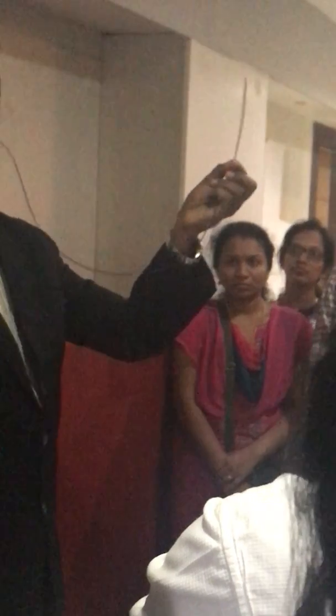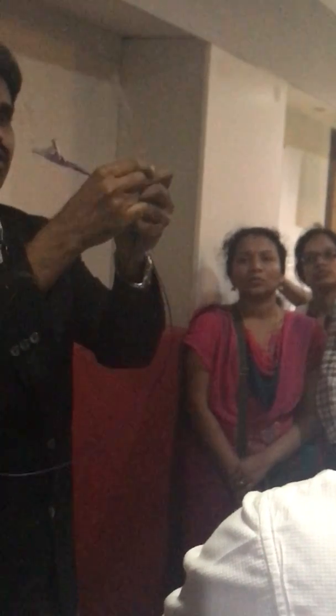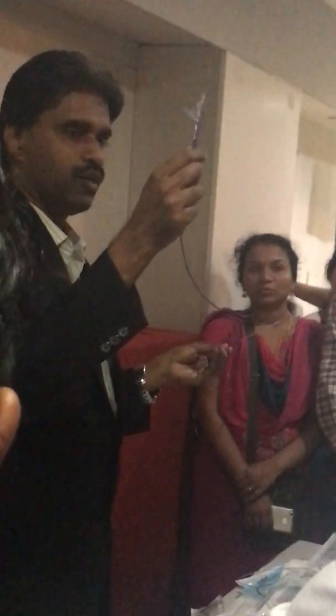What is this catheter? Balloon. This is a balloon catheter. Okay, you'll see there are two lumens, and also you can see the balloon. So why are there two lumens here? One is for flushing, the other is for balloon inflating. So how will you know which one is for flushing and which one is for the balloon?